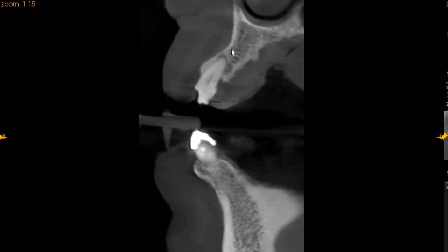Moving to the lateral incisor on the upper left hand quadrant, we can see that there's been crown cutting done. We see a periapical radiolucency, a hypodense area. We also see a little bit of resorption on the palatal aspect, and we can only see a single canal here present right at the tip, starting right here. So this tooth probably is non-vital.